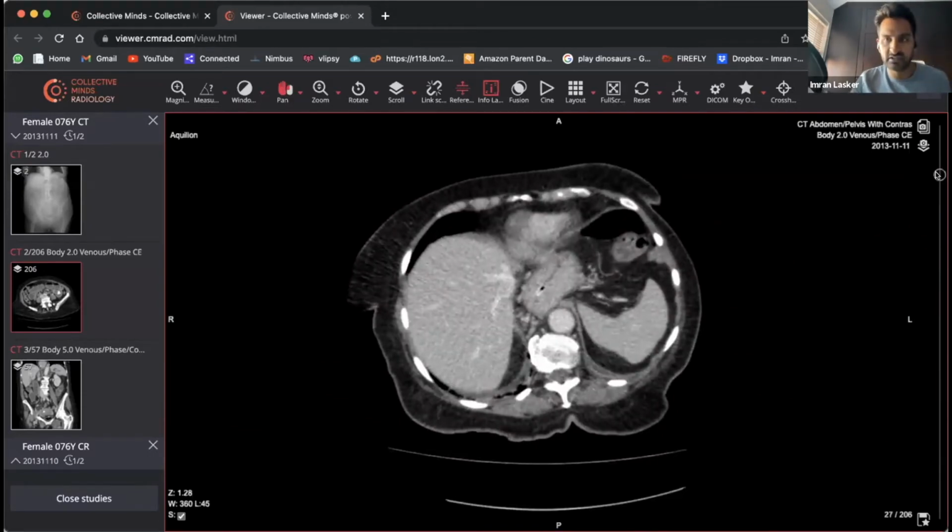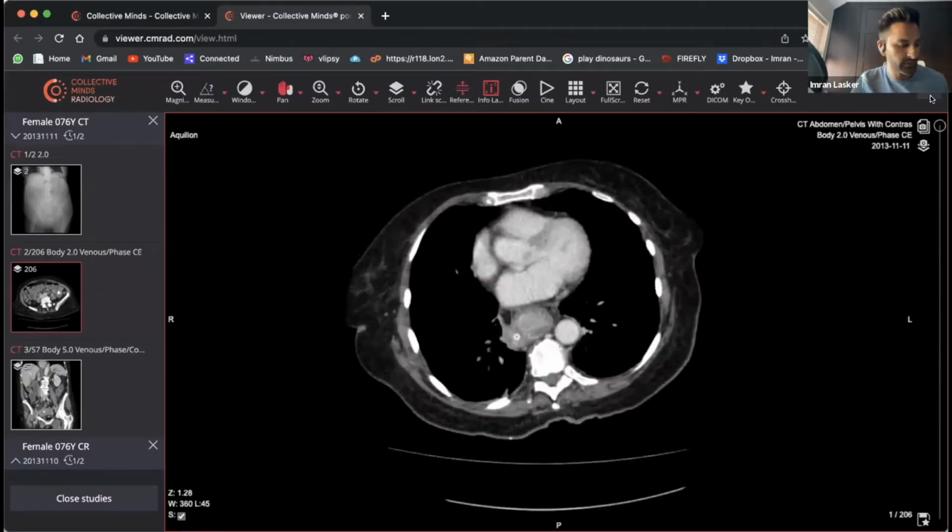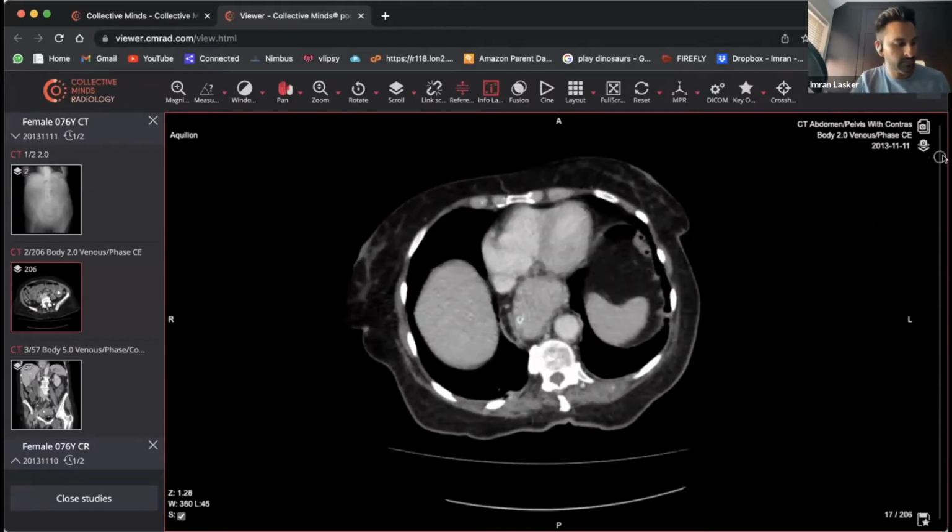So then what you need to do is scroll down. Let's just follow the rules. We go right from the very, very top and go all the way down to the bottom. And then hopefully something jumps out at you. If it doesn't, don't worry. We're going to go through it all anyway. So let's go from the very, very top all the way down.